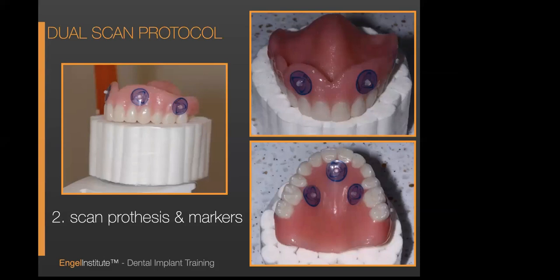So when they see this scan, they see the teeth up here and they see the bottom of the CT down here, and that's it. So they can clearly decipher where the edges of the teeth are. And the reason that's really important is because they merge the two scans together, you've guessed it, by the edges of the teeth.